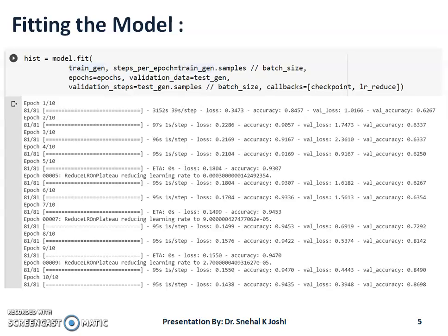You can observe that with each epoch, the loss is reduced and the accuracy for the training set as well as the validation set is increasing. At epoch number 5, the reduce learning rate trigger, which is part of the callbacks, executed, and similarly at epoch 7 and epoch 9 it was executed. Look at the final outcome we obtain at the end of the 10th epoch.